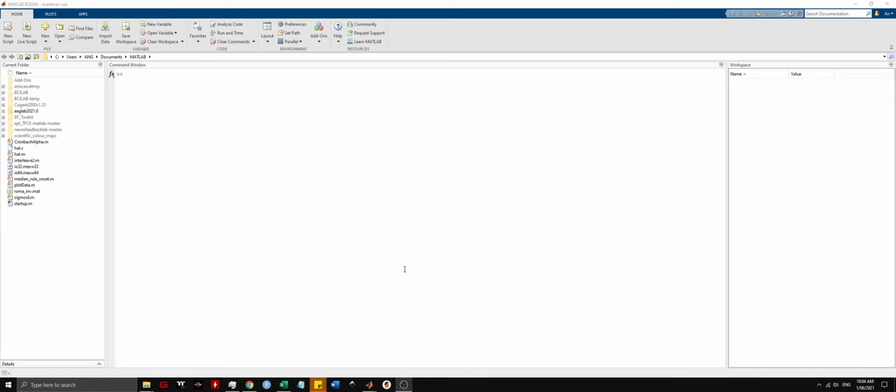With respect to noise, noise is basically activity in your data that you're not interested in. This can be non-brain sources of activity, such as line noise interference, or it can also refer to brain activity that's not task relevant. Basically, it's not practical to get rid of all of the noise in your data without also getting rid of some of the signal. So try not to get too carried away with eliminating noise in your data. You just want to reduce it by getting rid of the larger and more obvious sources of noise.